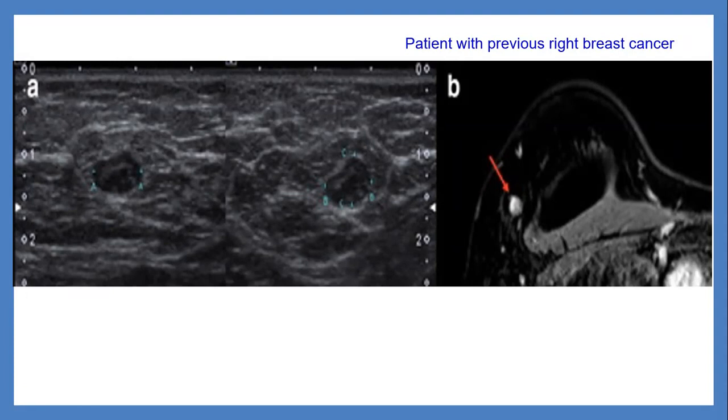Yes, it is oval, not so elongated or lentiform, but at least it's still elongated. It's still oval, and it's still circumscribed. The only features are asymmetric cortical thickening with an eccentric attenuated fatty hilum. Yes, this corresponds to that seen on the MRI.